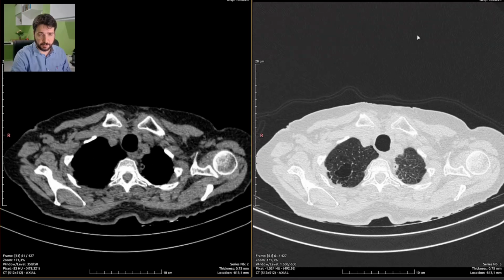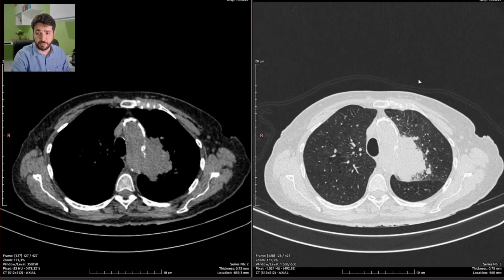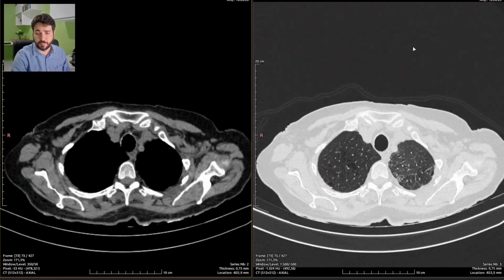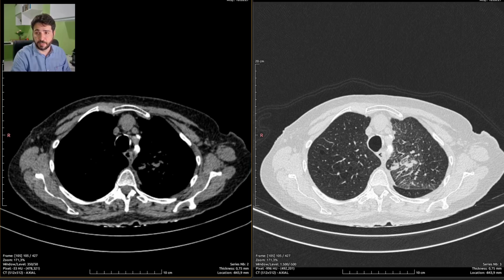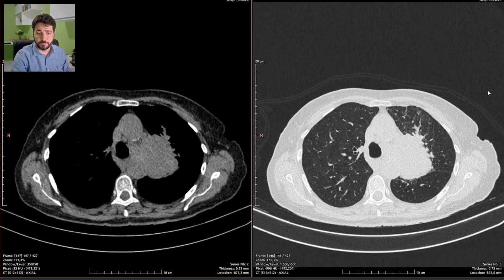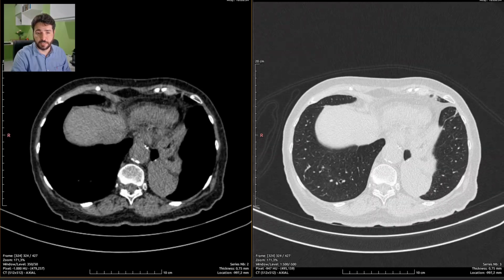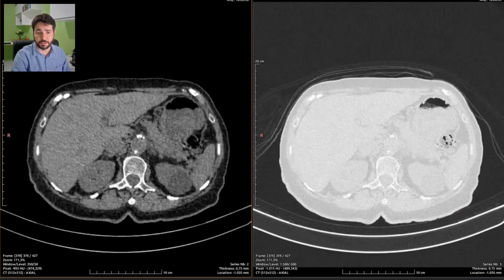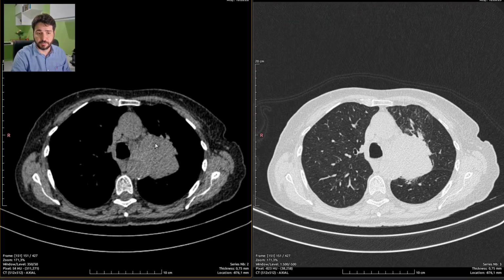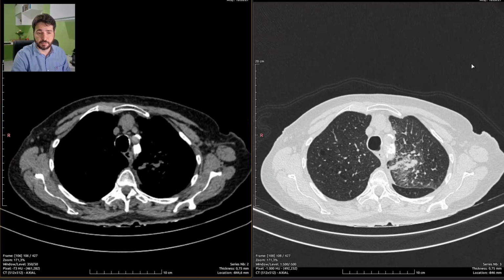So fine. So I know you guys are screaming on your chairs, saying, come on, report the masses, pulmonary masses. Calm down. Let's look for anything else before we go to the most obvious lesion, which is right here and right here, so we don't actually miss anything else that is of importance. Also, there is enlarged lymph node, secondary enlarged lymph node.